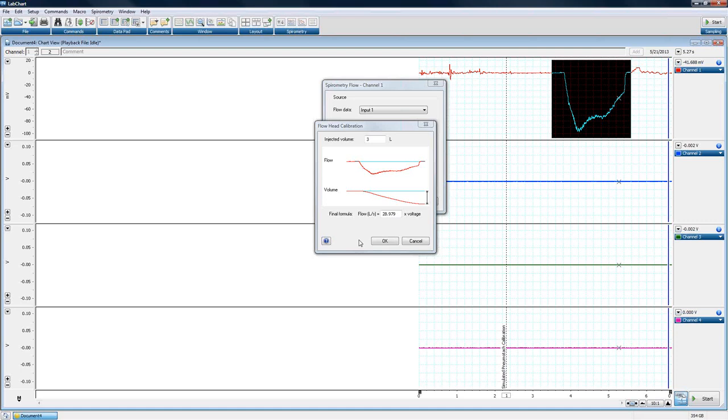We try very hard to make our help menu as useful as possible, and the best way to look at it is as a paperless manual. So definitely do not be scared of it. It's broken out into topics, and if you're in some specific region in the software, quite often you'll see these little help menu buttons. They'll get you the specific topic that covers what you're doing.